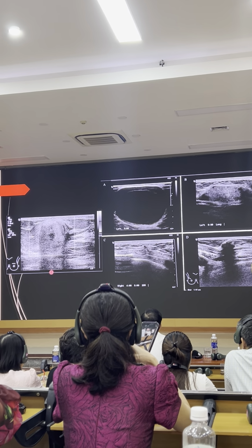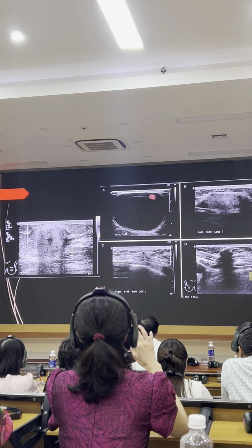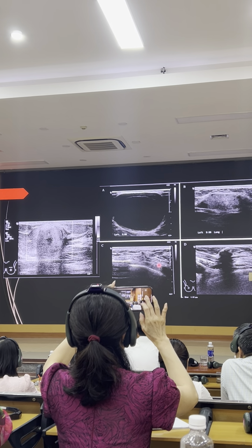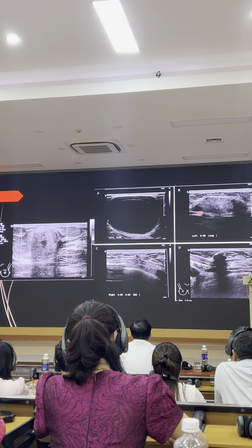These are all images of fat necrosis. So this one's very cystic. It's pretty much developed completely into an oil cyst at this stage. This one here is a bit more of an irregular mass. Again, it appears indeterminate. You would probably biopsy that. And these two are a little bit more benign.